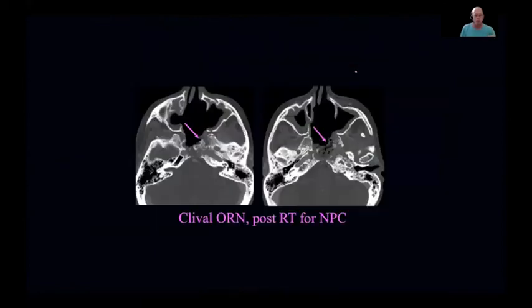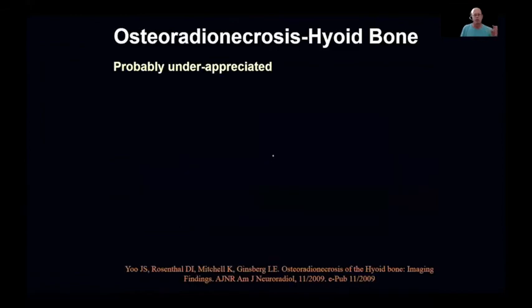So I could show many cases of this, but I'm just going to briefly show you patients who are radiated for nasopharyngeal cancer often get a combination of necrosis in the roof of their nasopharyngeal soft tissue necrosis, which exposes the skull base, which is already radiation weakened or injured, and we can end up with this very nasty skull base type picture. There's no tumor here. This is all soft tissue and osteoradionecrosis of the skull base.